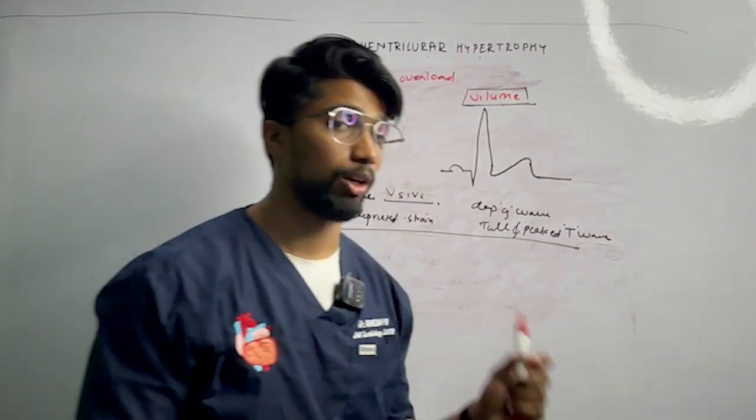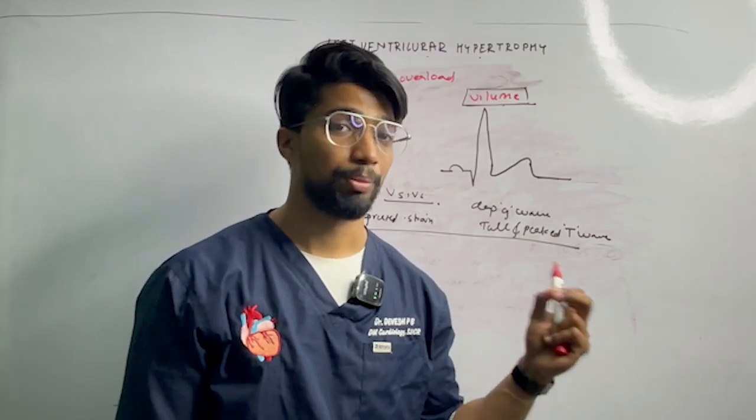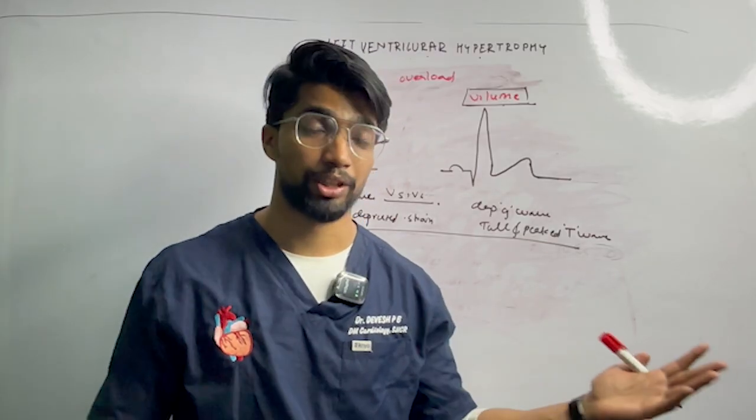So ECG can tell you a lot. Even just by looking at the ECG, you can tell whether the patient has just hypertension or other volume overload states.